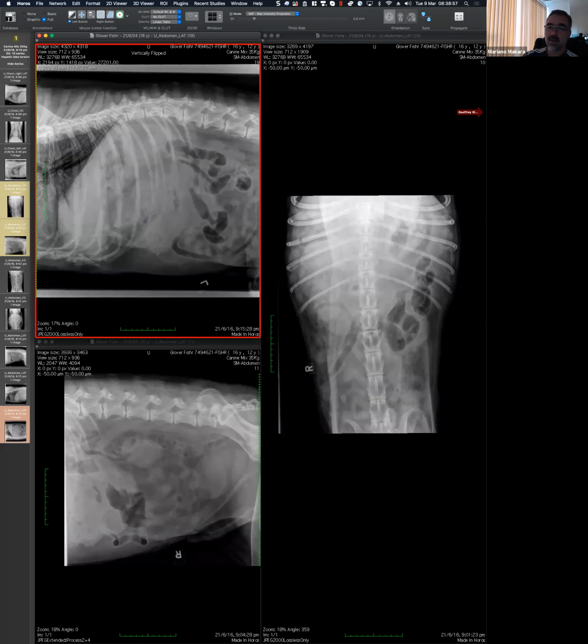But then an intestinal mass, either from the colon or from the bowel, I think there are good differentials. Something in the spleen, along the lines of a neoplasia with a secondary infection, abscess, and then gas. We went through the torsion, and I think it looked different. This is more like rounded. Probably, I don't know if we want to still keep it there or not. Any other differential? I suppose something coming from the stomach.